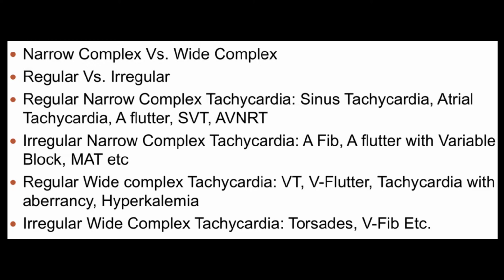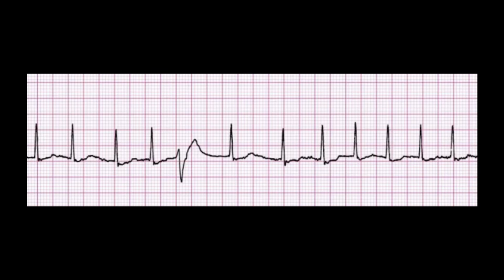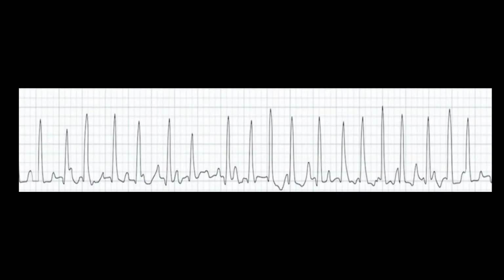So again, is it narrow versus wide? Is it regular versus irregular? And those are your big branch points. And here's some different examples here.